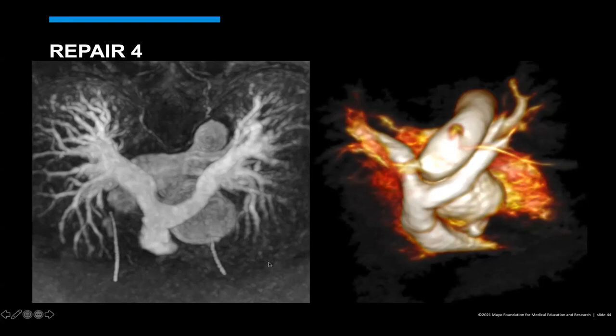So you've all had a chance to look at these images for a little bit. What's unusual about this case, we're looking at the thoracic vasculature from the top down. The anterior chest wall is down at the bottom, and the spine is up here at the top. You can see the aortic arch, descending thoracic aorta over here.